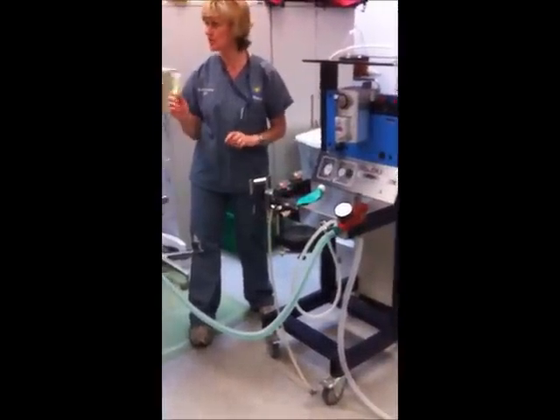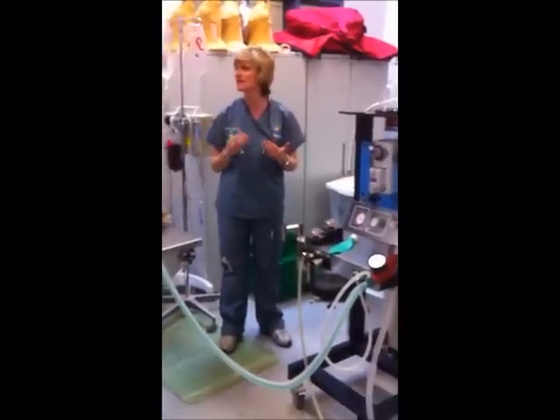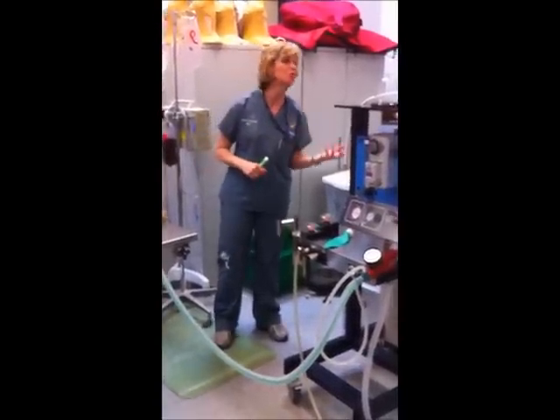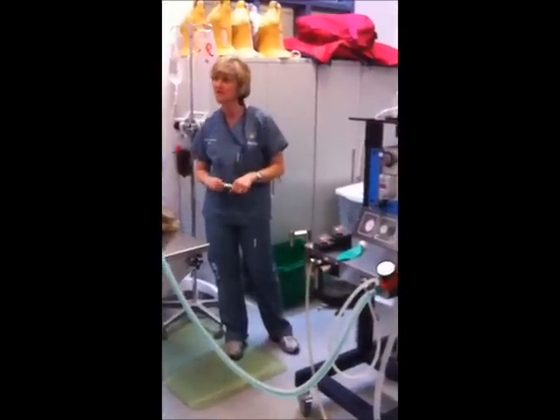Now, will you have to say that in the test? You won't have to, but I want you to understand why, because it's dumb for me to say just memorize it. Understand why. But on a test, you might get something that says, you've got an animal that's 2 kilograms. Which system will you use? That's the kind of question you would get.